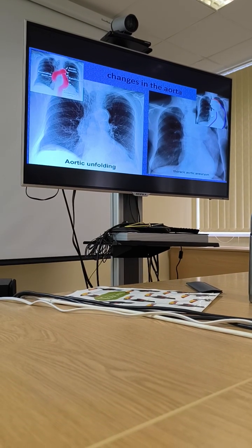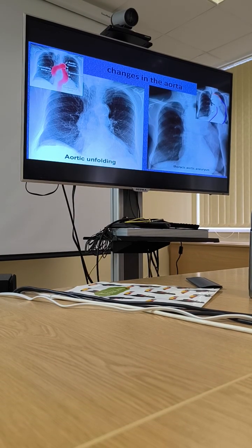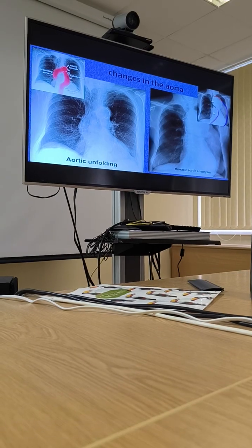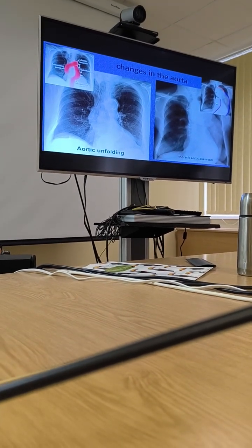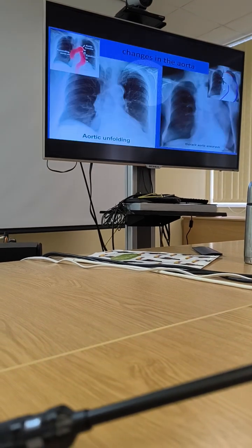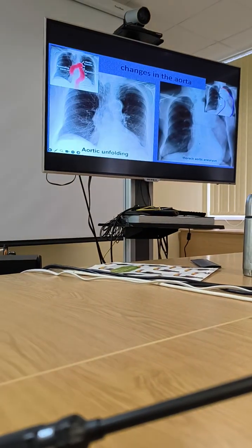And compare the situation when we see aneurysm. Aneurysms are different, but usually they make the mediastinum look special. So this is not really a typical aneurysm. This is a post-operative aneurysm. See the features of operation. Yeah, again this metallic suture.